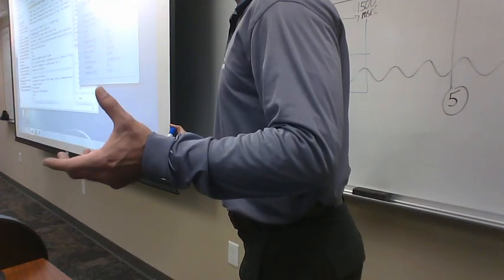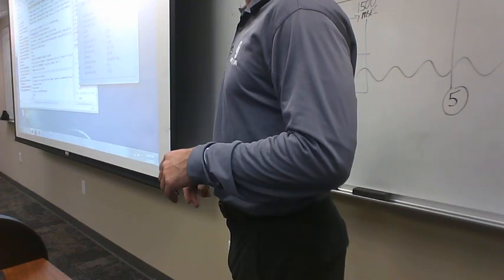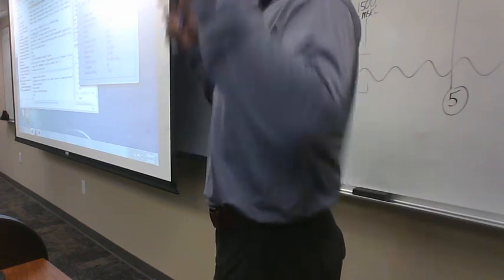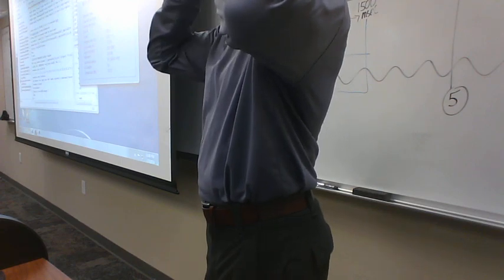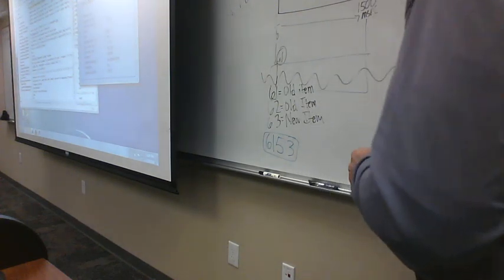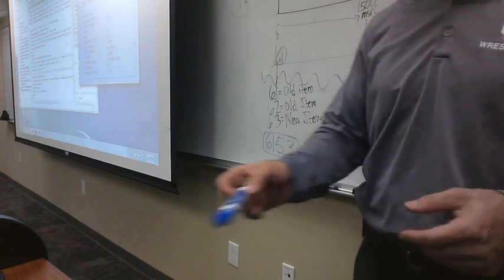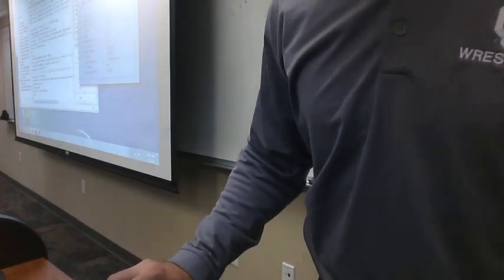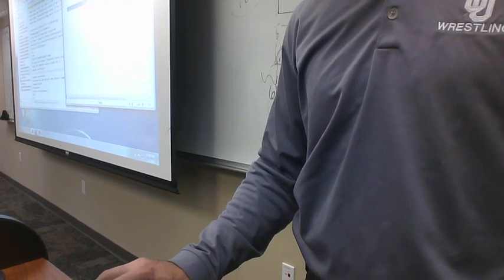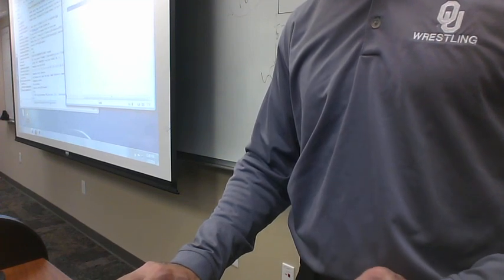So moving forward, it will be important in the class that you have a good understanding of these codes. Okay? Because it's our translation to provide insight into the neurobiology of our conscious experience. So it's really pretty important. But anyway, we have this code, but we have these extra ones that we need to delete. So that's what I'm going to do here. That's why I took this code here, and I just said I want to delete these events. Okay? And then I'll hit F9. It runs.